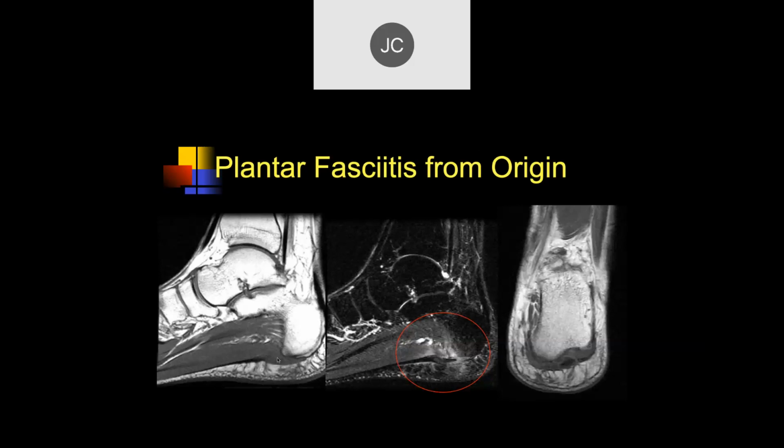You can see the thickening here due to chronic tendinosis. Like we've talked about in the shoulder, every patient who has a tear of the rotator cuff, at least in large studies that have looked at cadavers, they all have severe underlying tendinopathy, degenerative disease. The collagen fibrils are all disorganized, with a lot of microscopic tears. Normal tendons and ligaments don't tear. The bone is the weak point if you have normal tendons, just like in kids. But in most adults, we start developing degenerative changes of these tendons, so we can get tendon injuries.